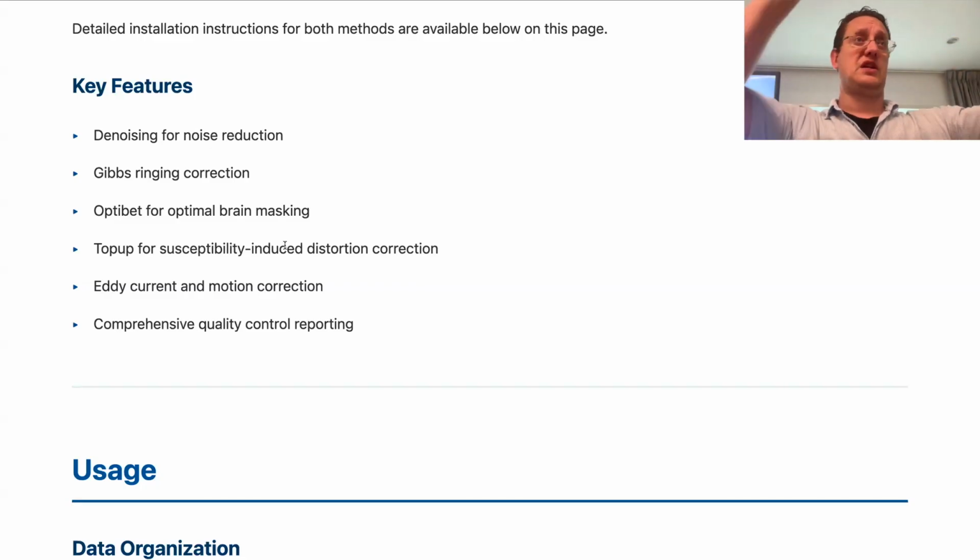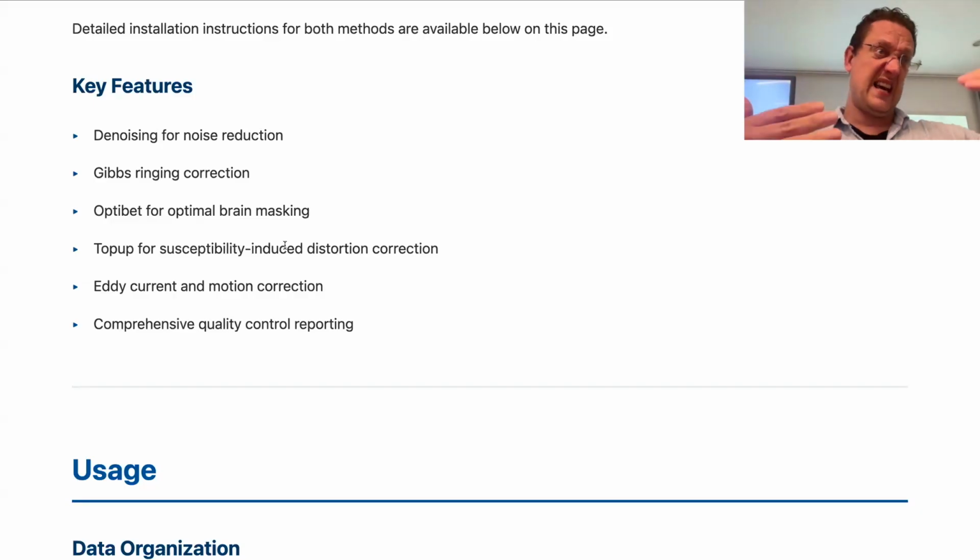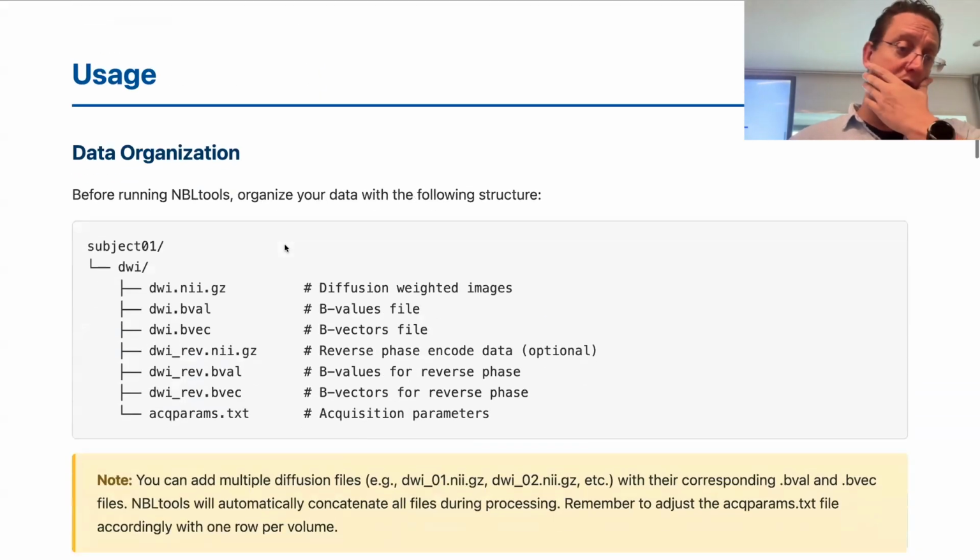You can sort it out immediately, see the naughty one, and you go and check immediately for the worst, and then you start to go down. At some point, the data starts to get better, and you know that everything below that is actually good data. So if you want to, instead of checking 700 brains, you can check probably 20, 30, and then you know that everything else will be fine because it's quantitatively better than the one you already checked. Okay, so this is something that you can use as well.